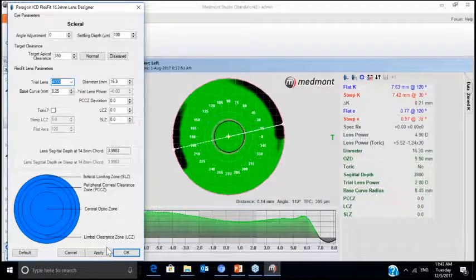The cornea is likely at around 6 millimeters out, roughly. So your lens is vaulting all the way past the cornea at around 6 millimeters, and it doesn't touch itself down till around 7 millimeters from center, or about 14 millimeters diameter. And we see it landing and vaulting over top of all the corneal tissue.